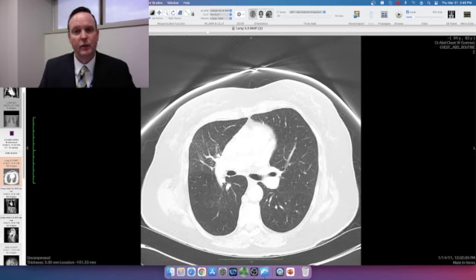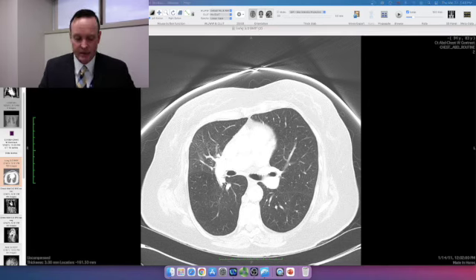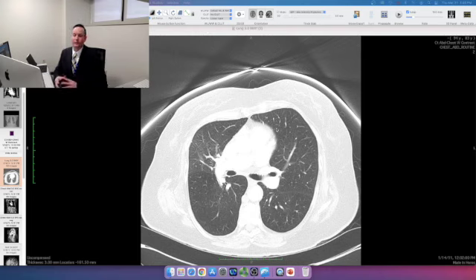So those are 3 cases of consolidation that I wanted to walk you through, as well as considerations for differentiating the types of consolidation.